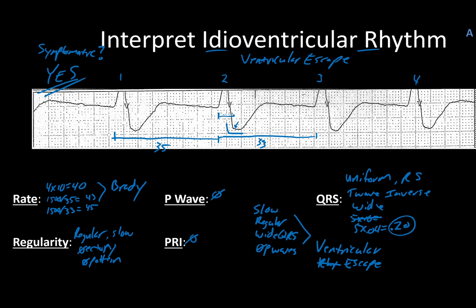Other fun fact, I'll wrap up real quick with this one. This is from another Comfort Cares patient. We withdrew life support over the course of a few minutes. The patient quickly declined. This is what immediately followed a burst of polymorphic V-Tach. They were tachycardic, and then they did a run of V-Tach for about 30-40 seconds, and then dropped into this rhythm for about a minute or two, and shortly thereafter they went into asystole.